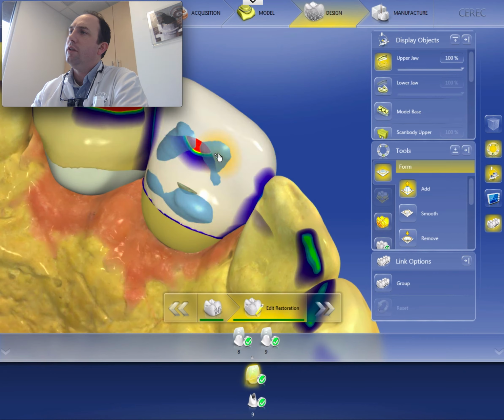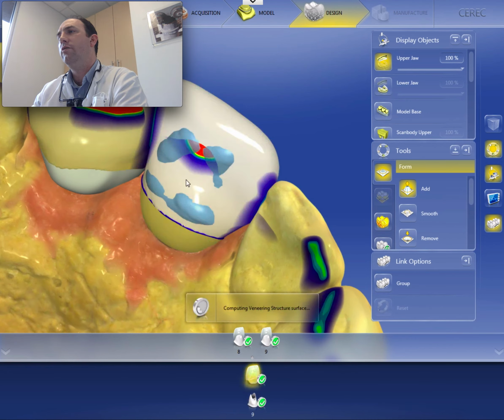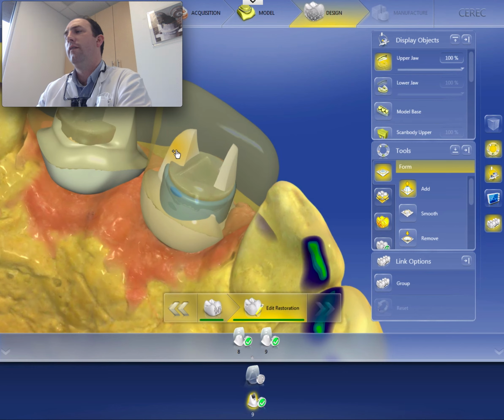We are going to have to do a little bit of, come on now. Why are we calculating? Not sure why we're calculating. All right, come on now.